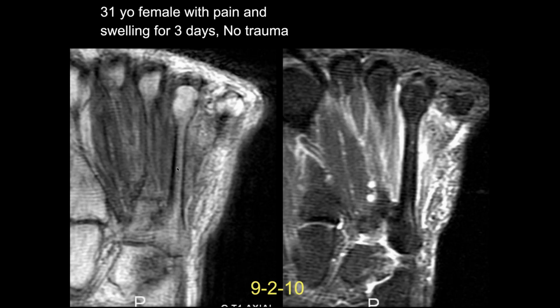You can actually get bone injuries that may be subtle, and the issue is in a lot of these small bones, you don't have a lot of trabecula, and you can injure the cortex if they're minor injuries without getting a lot of edema or hemorrhage. But we can see a lot of hemorrhage on the outside, so you have to be a little suspicious on these.